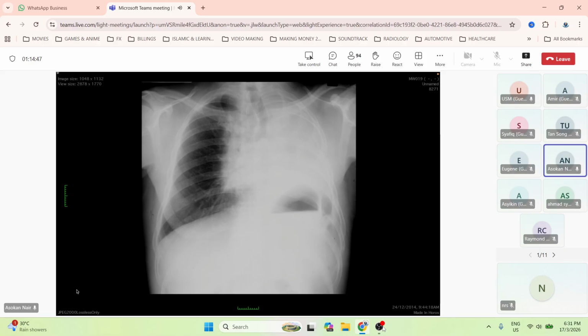Metastasis into what? Hilar lymph nodes. Yes. It could be intrapulmonary within the lung parenchyma as well, but these findings also can be consistent with radiation therapy if there was radiation at the region.